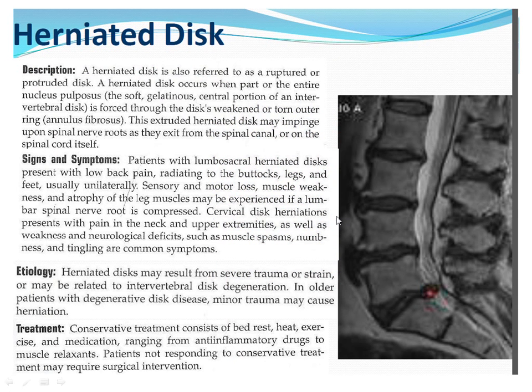So here's the herniated disc that I'm sure you've all seen in your clinical rotations. The discs are cushioning our vertebral bodies. Once a vertebral body gets a little bit older, it's at risk for herniating. What happens is the central portion of the disc, the nucleus pulposus, can become ruptured or protrude through the annulus, the denser fibrous portion of the disc, or the whole thing can just kind of relax with time.